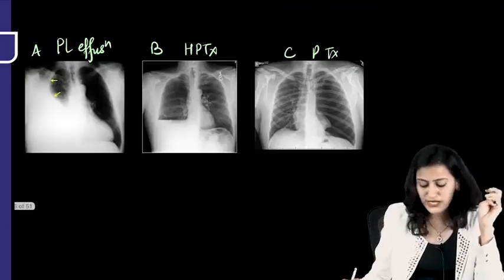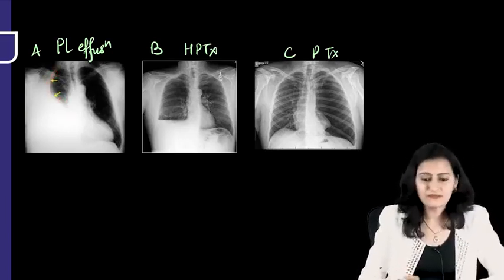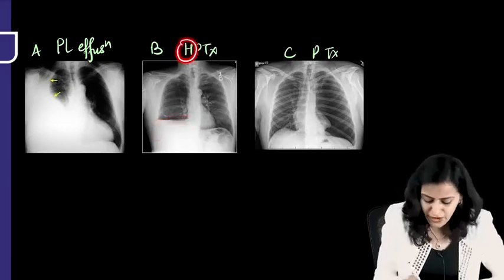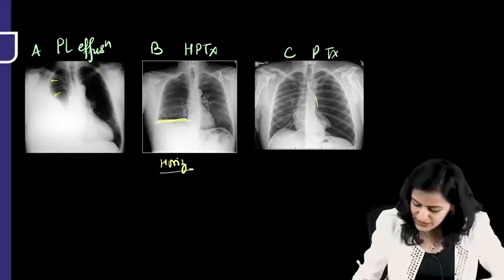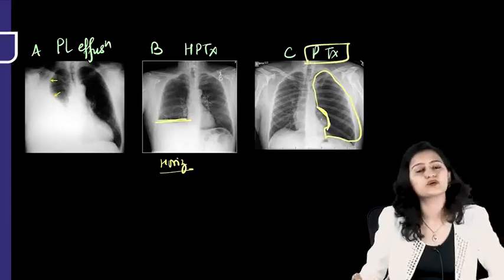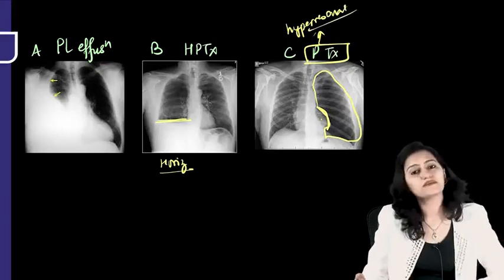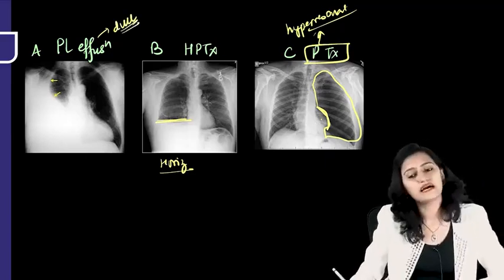Okay. Now, going to the pleural pathologies, a quick review. So when you have this S shape or the meniscus curve, then it is pleural effusion. When it is horizontal level, there is blunting, but horizontal level, remember H for H, horizontal is hydropneumothorax. And when you have this black appearance with the visceral pleural line, the collapsed lung, then it is pneumothorax. So pneumothorax is the one which will give a hyper-resonant note on percussion. Another important clue in the clinical history, pleural effusion, because it is water, will give a dull note on percussion, right?